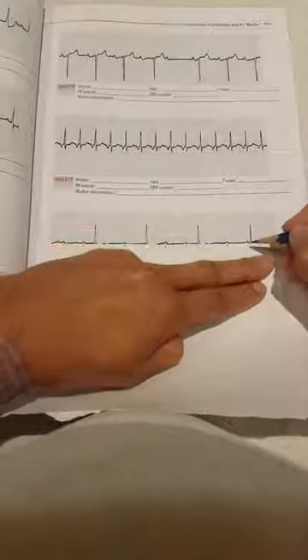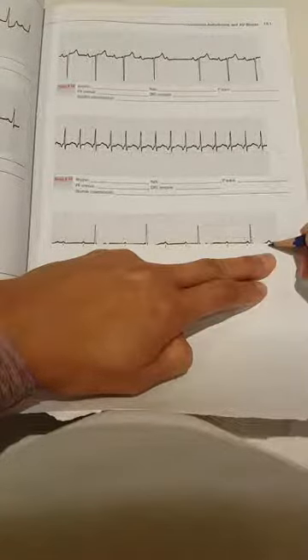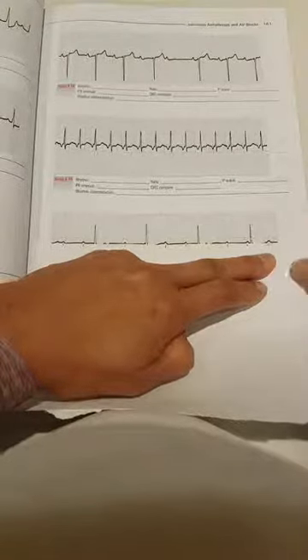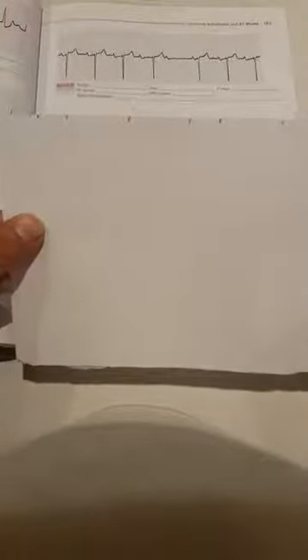And then moving down here, this one looks like a P, and this one looks like a P. So I understand that not all of you would necessarily pick out all those P's, but the majority of them we would agree on. So you remove your piece of paper, you'll see that you have a pattern of notches or marks along the edge of the piece of paper. That is not regular. However, if you recall that in blocks, the P to P interval is regular.